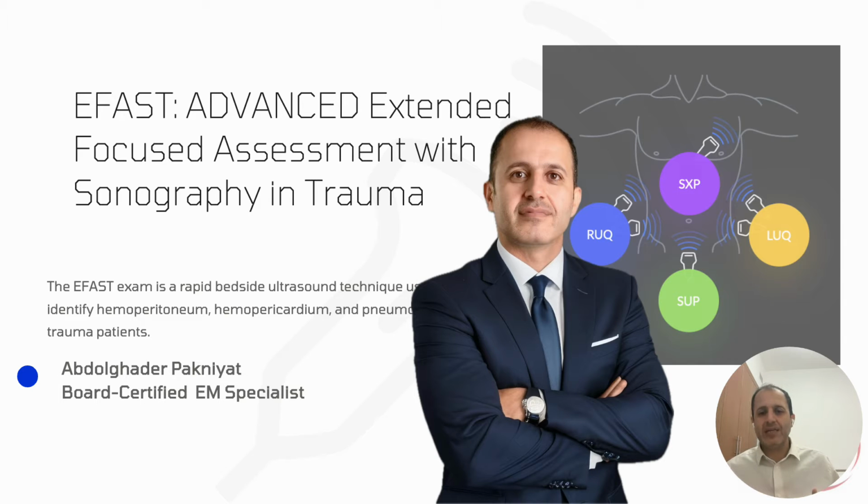with abdominal pain or suspected intra-abdominal hemorrhage, in cases like ovarian cyst rupture, ectopic pregnancy rupture, or any case with abdominal pain in a stable patient. You can use it to see if there is free fluid or not.